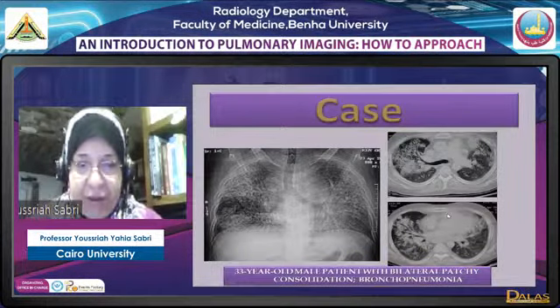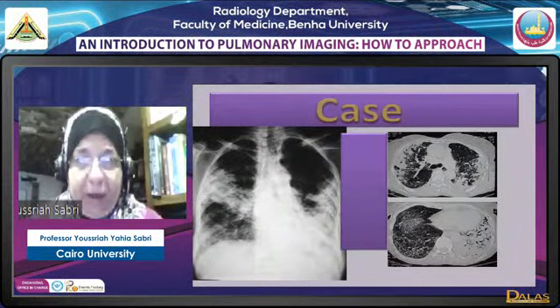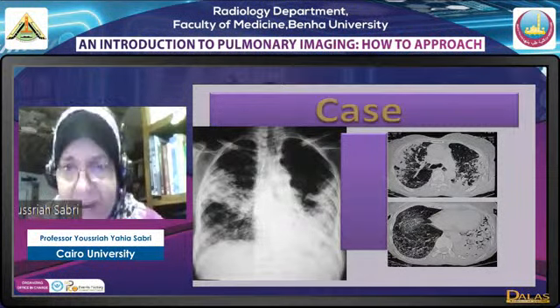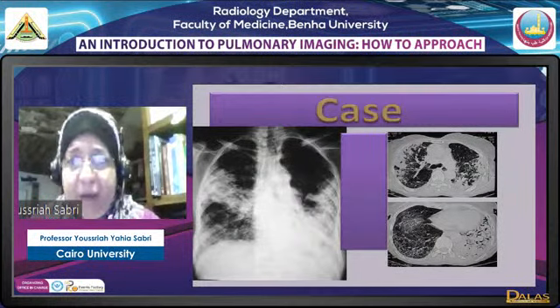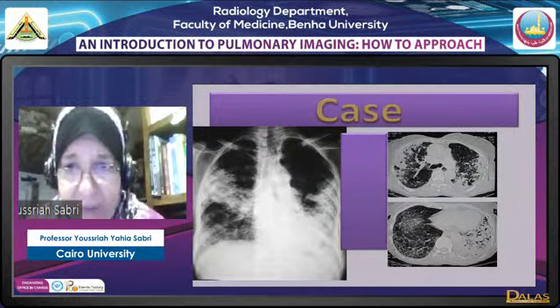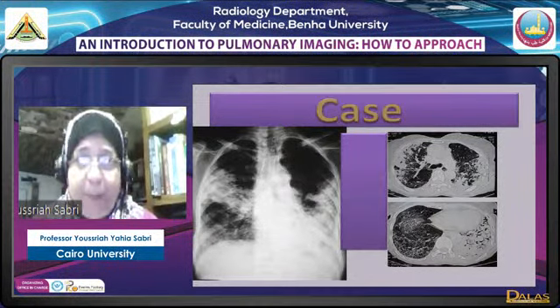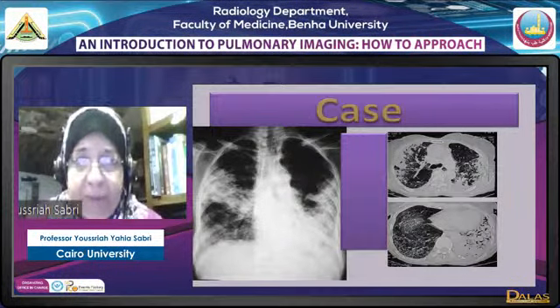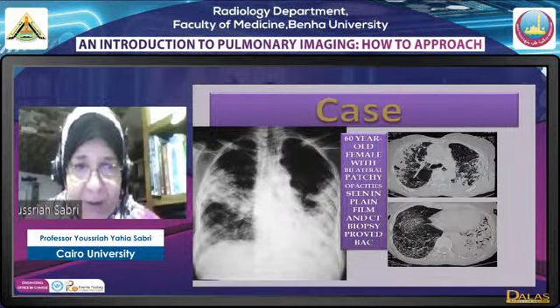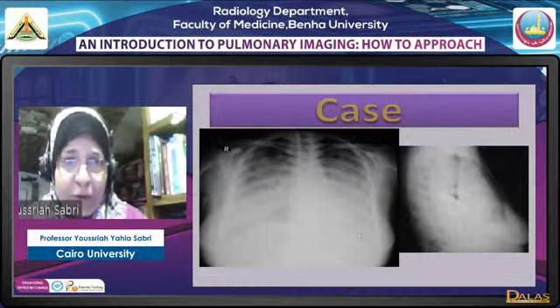This was a case of a 33-year-old male patient with bronchopneumonia, patchy and bilateral. Now, here another case. This was an elderly patient that was diagnosed for months as bronchopneumonia, and then finally they decided to take a biopsy, which proved, at that time diagnosed as bronchoalveolar carcinoma. Of course, you all know that this terminology is no more in use, and this is one pattern of adenocarcinoma in the lung, okay? And this patient is a 60-year-old female with patchy opacities seen, as you can see. And this is a very common history, by the way, this follow-up of pneumonia for months.